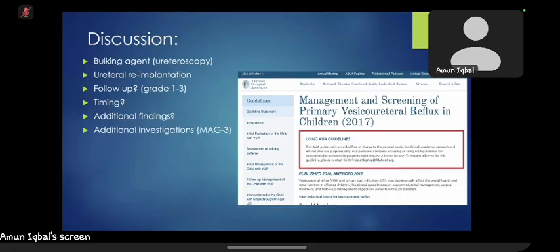And that will guide us more about whether the patient has a structural or anatomical abnormality, which could be the cause of recurrent UTI and reflux in this case. And there are multiple causes of reflux even. So in this case, as the patient had a diverticulum, a structural abnormality, this means that this patient can have complications in the future. So it's better to take a urological opinion.